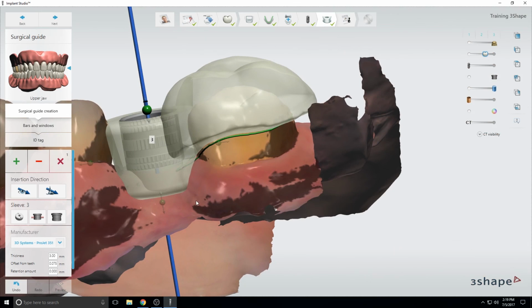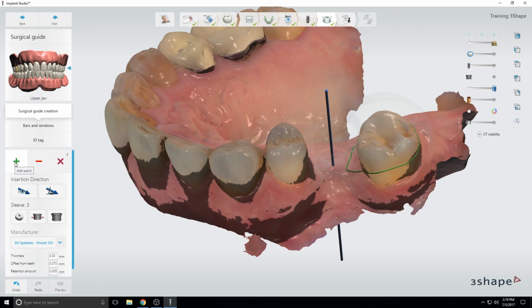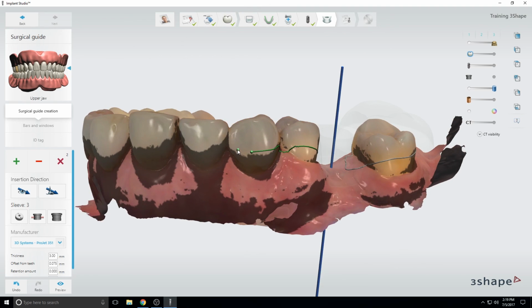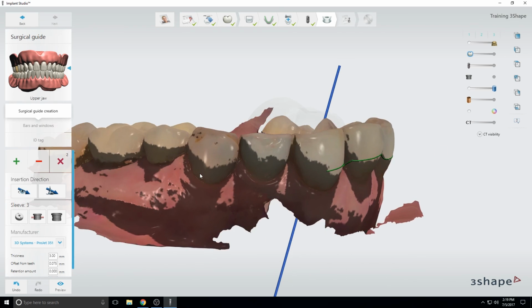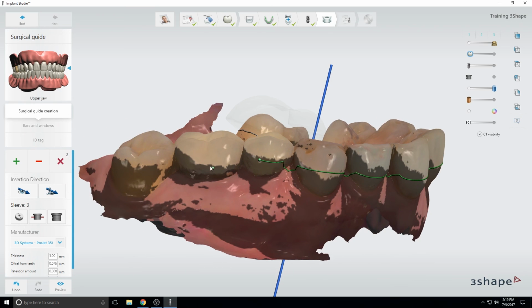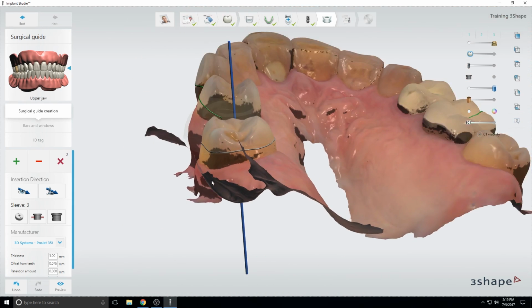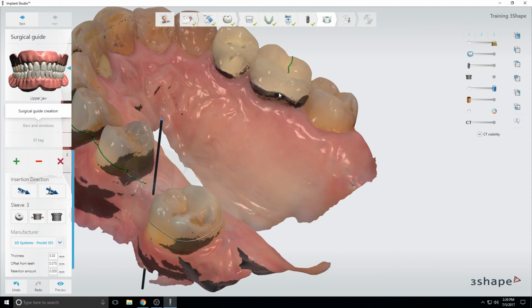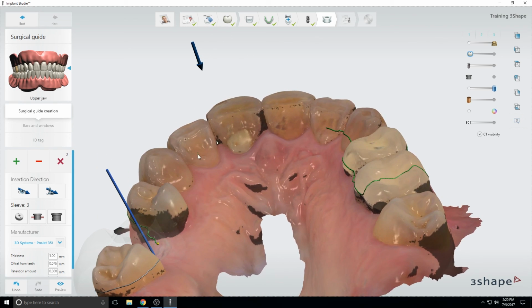Okay, we're going to do the same with the other teeth now. So turn off the sleeve so it's a little easier to see. And then we're going to add our second patch. So start in the soft tissue. And then generally I'll trace along the height of contour here. So I'll just quickly click through, and I'll go back and smooth out any areas. So I'll pick this molar as our endpoint, and we'll travel back until we complete our loop. So we'll complete the loop there.